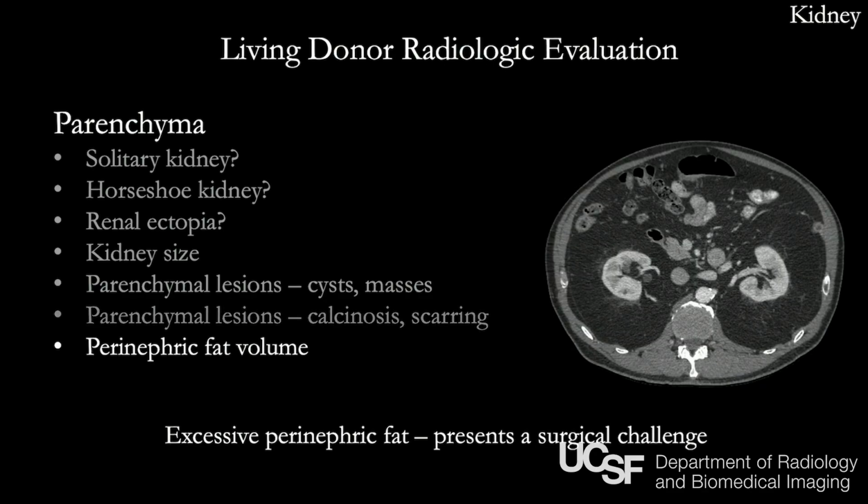Perinephric fat volume is something you want to pay attention to on these scans because most of these kidneys are harvested laparoscopically. And of course, when it's a laparoscopic procedure, right, a large rind of perinephric fat presents a kind of a challenging surgical scenario for the surgeons.